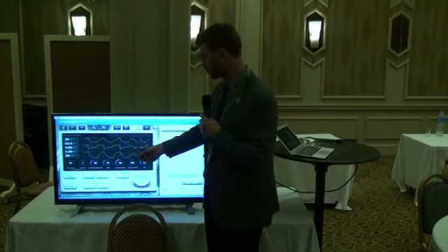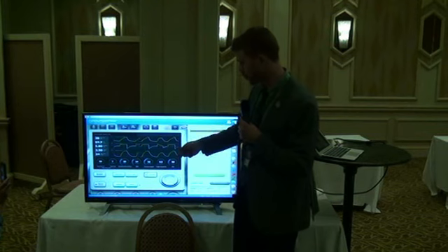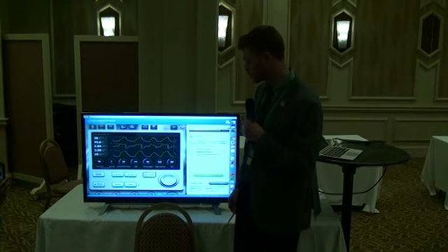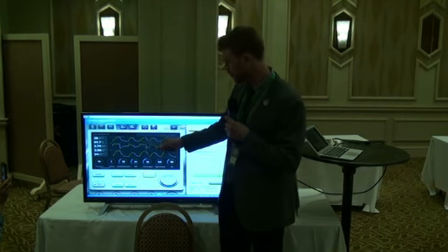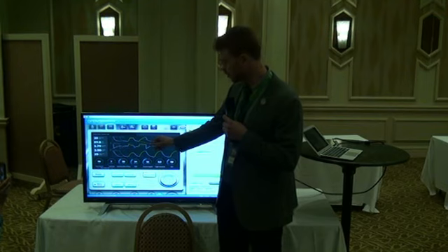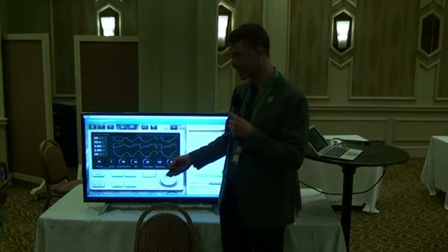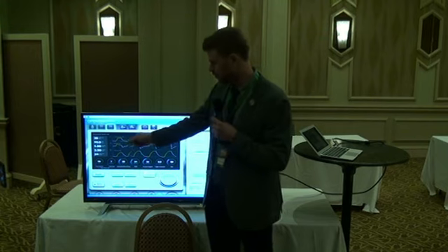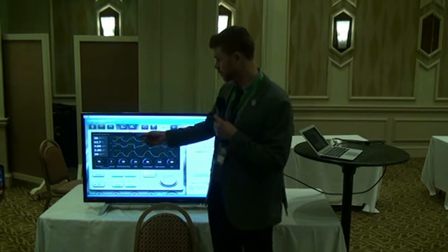It's SIMV obviously, so periodically this patient's breathing. That's what the yellow means on this ventilator. And then we have these pressure waveforms where the patient is having a spontaneous breath, is actuated, and the ventilator is triggered spontaneous pressure-supported breath. The flow obviously too is different during volume control versus pressure support or pressure control. You can see it's a more gradual increase, because it's just targeting the flow. It's doing whatever pressure it needs to do to maintain a set flow. Unlike pressure support, where the waveform is a little bit more controlled and kind of blocky, because it's just targeting the pressure. So that's what that is.